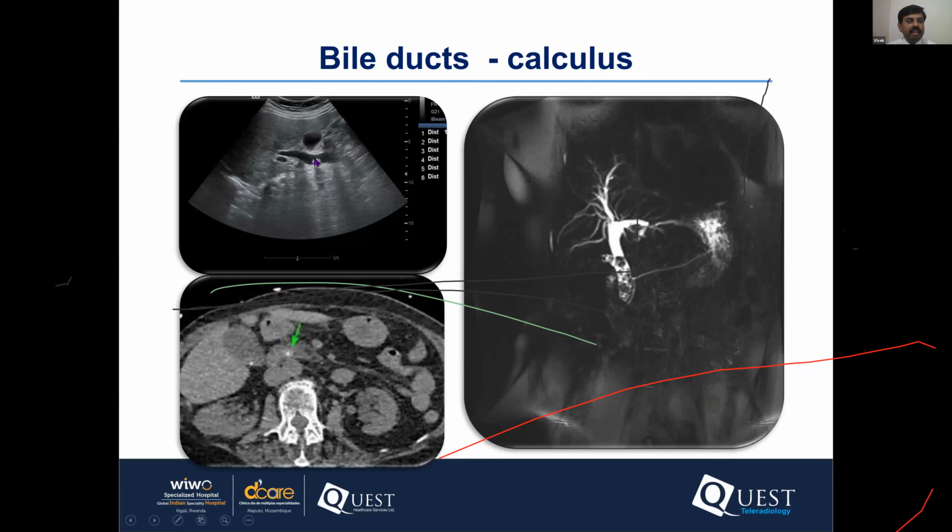So in ultrasound, the bile duct calculus will be seen as a rounded filling defect and causing dilatation of the bile duct by about 6 to 10 mm, and that is a natural hold up of the bile proximally, with dilatation of the proximal biliary tree and jaundice features.